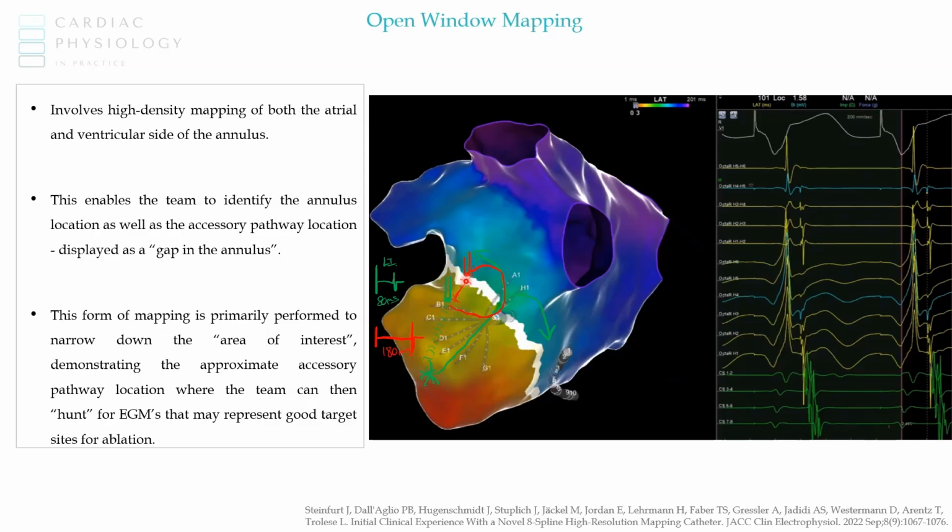And so what we can infer is that there's not a continuous wavefront of conduction between here and here, because it's inconceivable that in a normal heart it's taking 100 milliseconds to travel from this location to this location. So there is a discontinuity in our wavefront conduction time, and an electrically inert barrier between these two catheter locations, whether that be scar. But in this population with relatively normal hearts, it's unlikely to be scar.